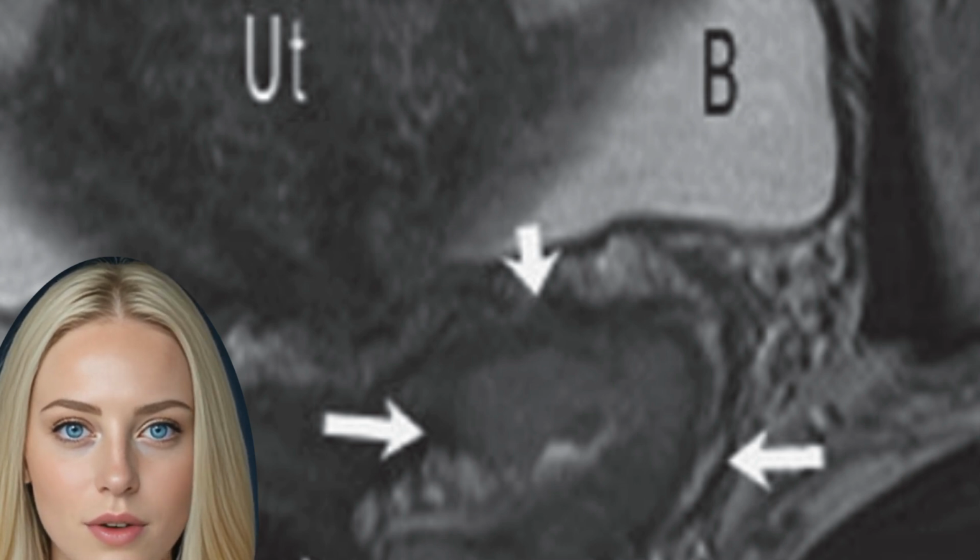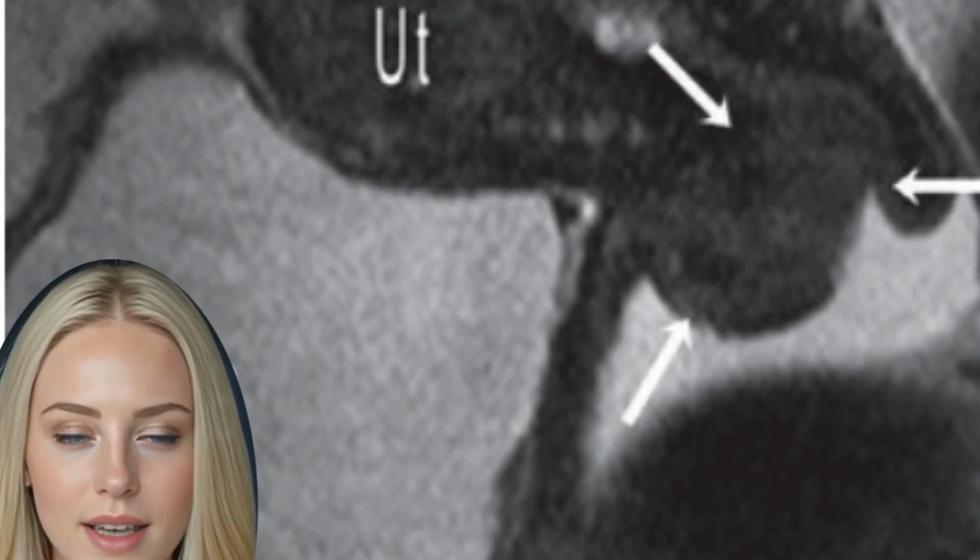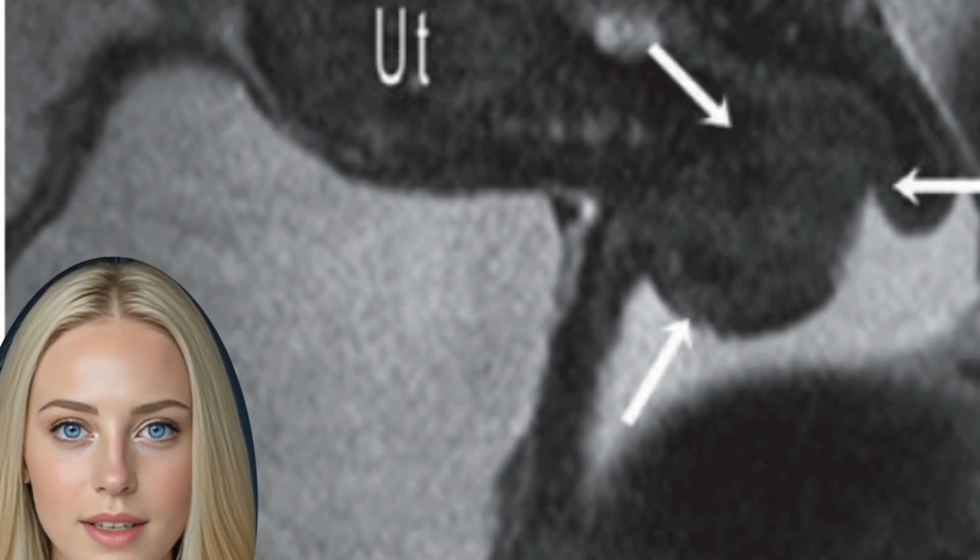should be checked to be within normal values. Endometrial cancer. Regardless of hormone status, the normal endometrium is always hyperintense in native T2W images. The junctional zone is hypointense and the outer myometrium is of moderate signal intensity. Endometrial cancer is moderately hyperintense in T2WI. However, small tumors can be isointense in regard to the endometrium and may therefore be difficult to detect.